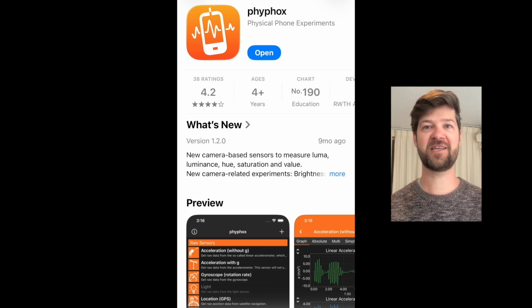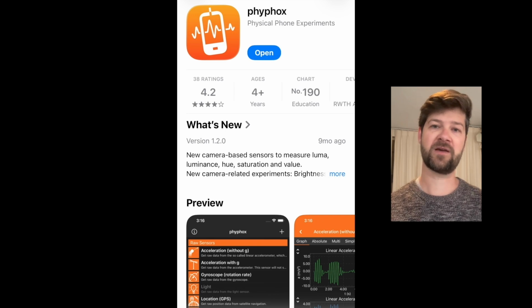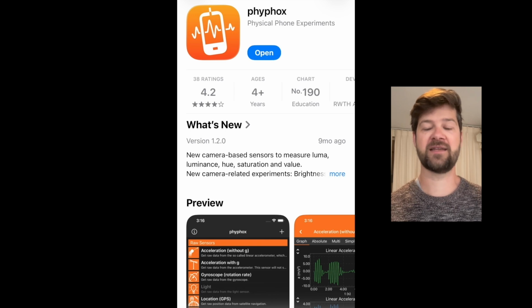Hi, in this video I'm going to explain getting gyroscope data with EP Animations, and hopefully soon EP latencies, using the Phyphox iPhone and Android app. Phyphox is an app made by a German university. It's free to use. It has a lot of functions, but we only need one of them for this, and we can combine it with EP Animations to show how the head moves during a recording.